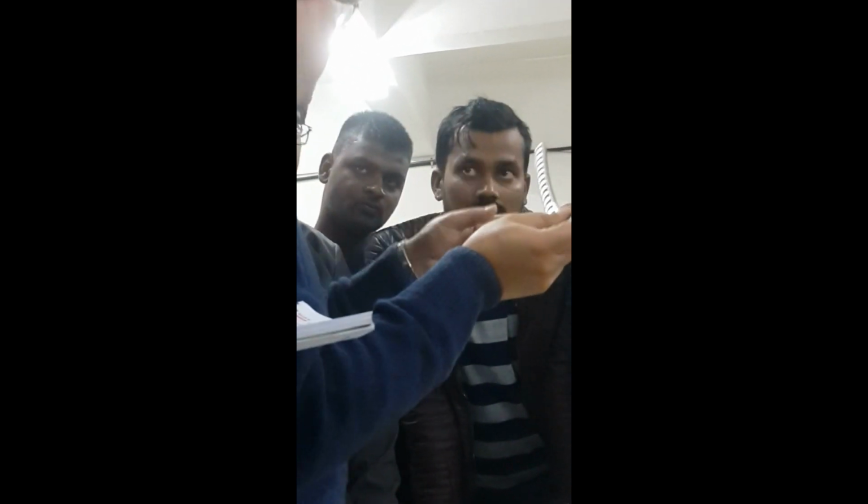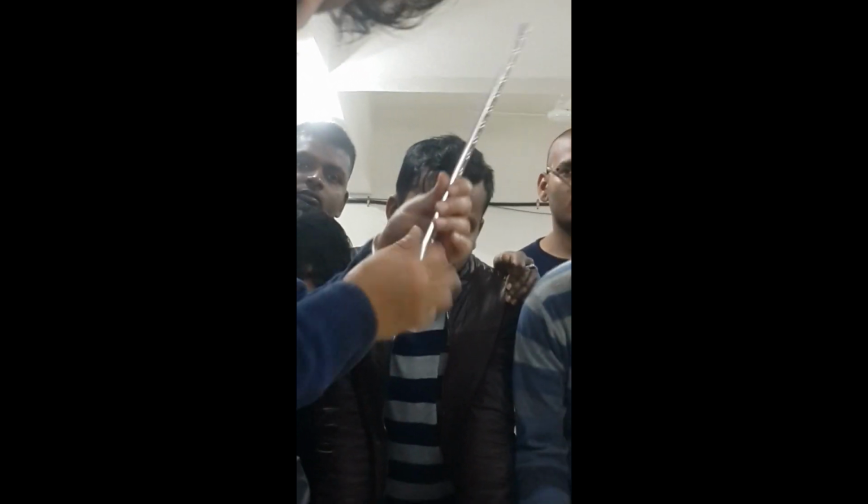If you put all locking screws, it cannot give compression. To apply compression you have to have the normal screws. So when you see this implant being applied, you will see that some screws are simple, non-locking screws, and some are locking screws. Just remember there are two holes.